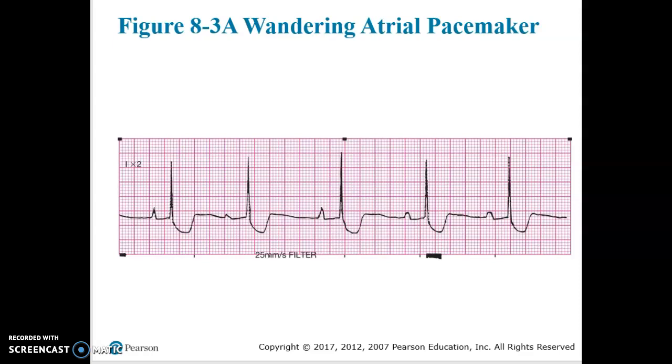Now we ask ourselves, is the rhythm regular, irregular, regular but interrupted? What is this rhythm? We can take our piece of paper, and remember we have to count between the R and R's. You can take a piece of paper and lay it up against the screen and put a dot here and a dot here, and you can drag it across and measure between each one. That's a quick way of doing that.